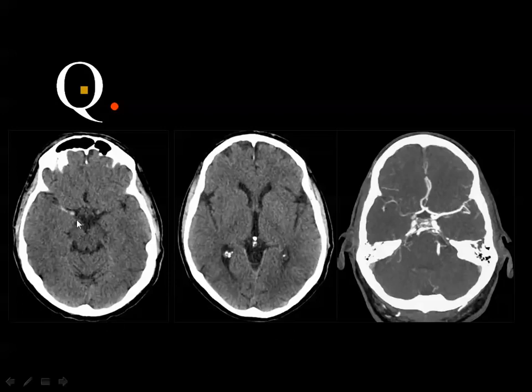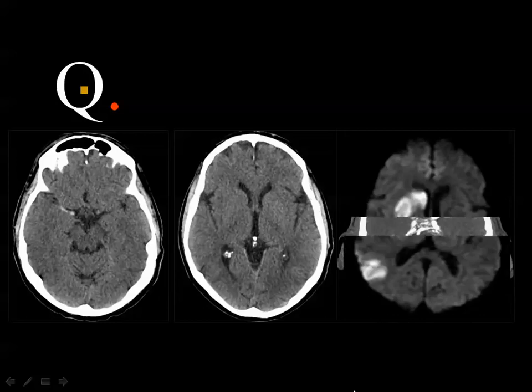Okay, and this is the middle cerebral artery, which is thrombosed. In the pre-contrast scan, you do not see a significant abnormality. This may be due to the patient tilt, but in the relatively lower section you can see the hyperdensity of the middle cerebral artery, denoting hyperacute infarction. And in the CT angiography, you do not see opacification of the middle cerebral artery compared to the opposite side, which is opacified. Because you do not see a significant hypodensity here, this is diagnosed as hyperacute infarction, and the best way to see this infarction is by the diffusion weighted images. You can see the restricted diffusion in the infarcted area.